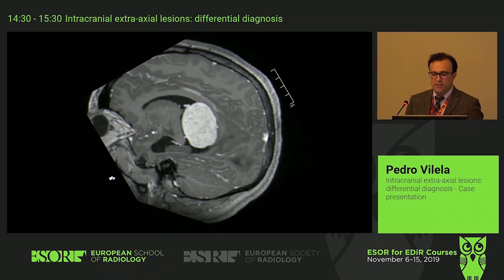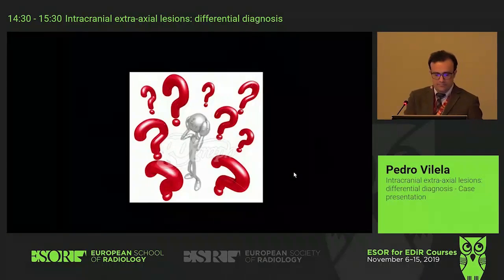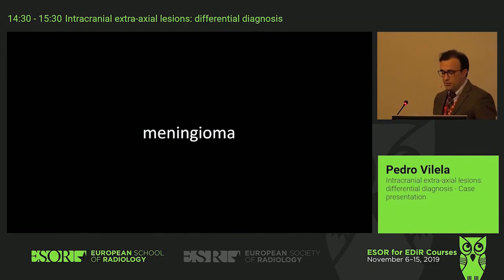Now we did a reformatation, to try to understand, and maybe this image will allow us to understand if it's intraventricular or extraventricular. You see? It's a strange oblique view. So the lateral ventricle continues here. You have a cleft there, and you had also a cleft there. So it was an intraventricular lesion. Okay? And it was indeed a meningioma.